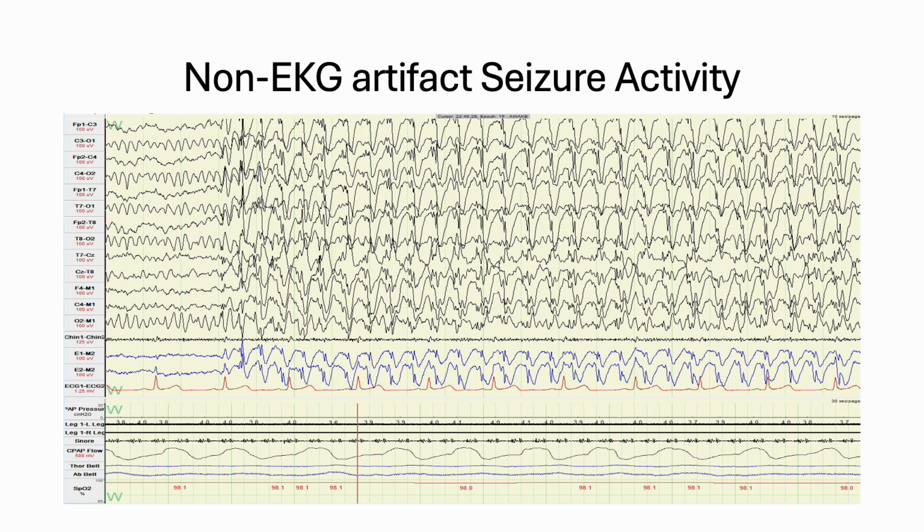The next study is also a clean record, and I specifically wanted to include this one because of the seizure activity. When EEGs are run, they include an EKG, just like we do, in part to check for EKG signals in the EEG. Sometimes the EKG can show up in the EEG signals, and they look like seizure spikes. But if you compare where the seizure spikes are and where the heartbeats are, they don't line up. For instance, here's a heartbeat, but the spikes are right behind it.